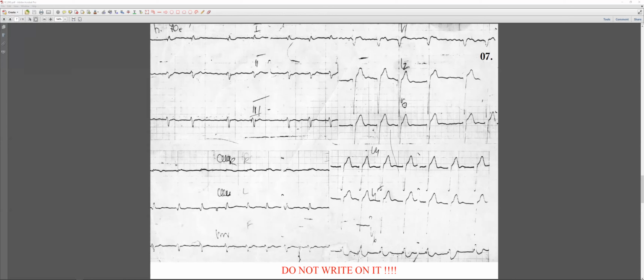And that's pathologic because in the left bundle branch block, you can see Q on the right side, but you cannot see it on the left side. So especially V5, there is no way that you can see a Q wave. So that could mean that this patient does have an anterior MI as well. Okay, because it's too big, anterolateral or extensive anterior MI. Okay.